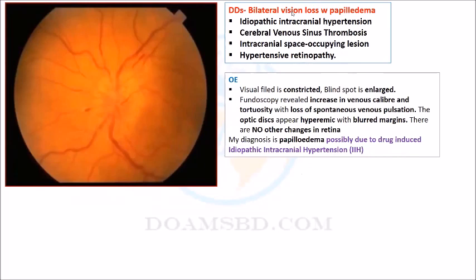We term it papilloedema. But in unilateral features, we term it papillitis, edema with an inflammatory nature appearance. So this is papilloedema, with a blurred optic disc and reddish hue, not white. If subsequently it becomes white, then it would be secondary optic atrophy.